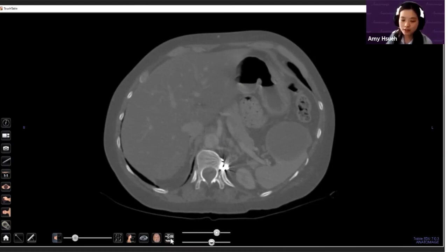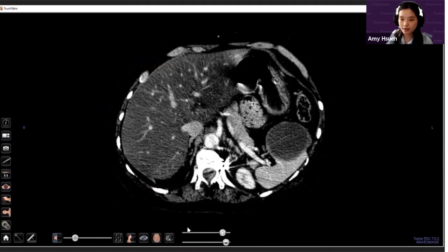So you can go into our predetermined filters and pick one that is more suited for viewing the liver. In this case, the very bottom one over here has some predetermined settings that make it particularly easy to see a contrast within the liver. Once you pull this up for the students, you can let them know, look at this liver, it's pretty dark compared to all of the hepatic vessels that are within it.